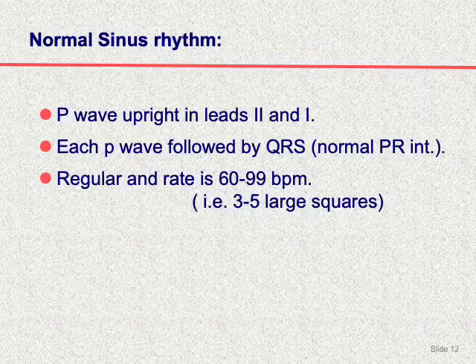The second thing we should know is the normal sinus rhythm. What do we mean by normal sinus rhythm? What we mean by sinus is two things. First thing, the P wave is upright in lead 1 and lead 2. This is in the sinus rhythm.